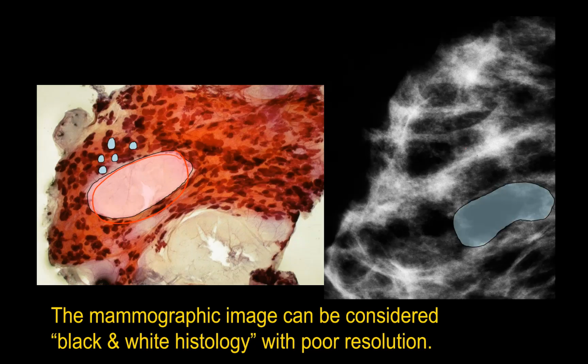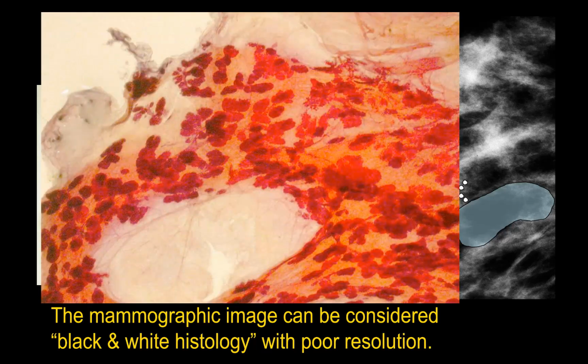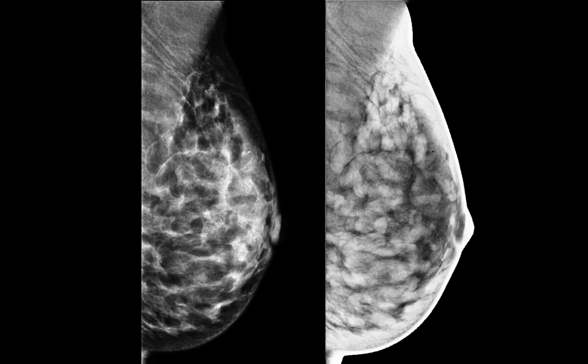Radiopaque, radiopaque. And these are the terminal ductal lobular units here, of which the disease is developed. So what you could do is the inversion: white and black, and black and white. Sometimes it helps. Quite often it helps. Or it actually kills the boredom of screening.